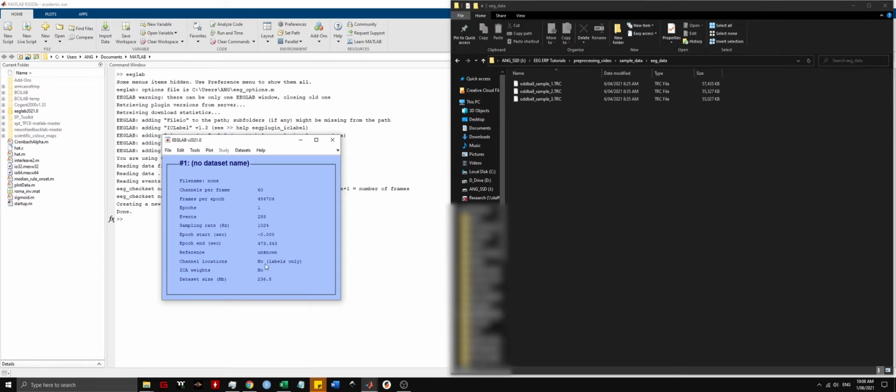locations are. Once you've loaded your data, it's a good idea to inspect the data just to see if your event markers are there and whether there are any unused or mislabeled channels to deal with. And also, when you're learning, it's good practice to inspect your data after each step just to see how your data is transformed. To plot the data, you go to Plot and click on Channel Data Scroll.